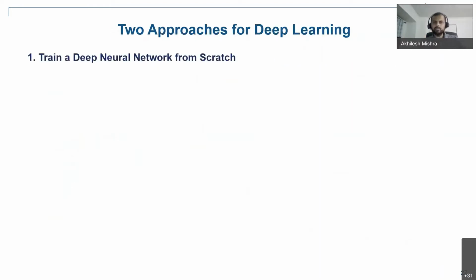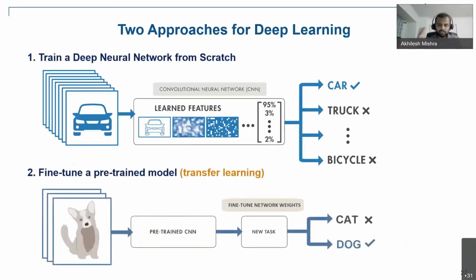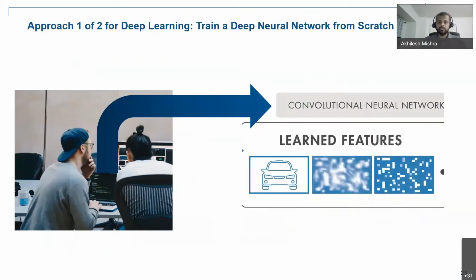In the transfer learning approach, we take networks which are already pre-trained. Let's say you find a good network like a UNet on the internet, and you can bring it into MATLAB through the ONNX exchange. And now you just have to fine tune that network and retrain it on the new images, and that's what we're going to see right now, to classify these new images.